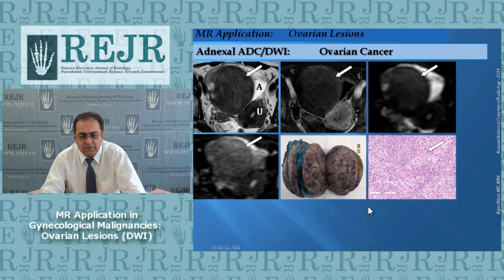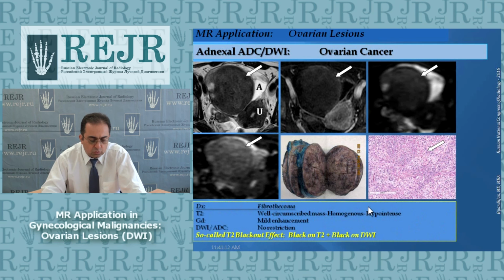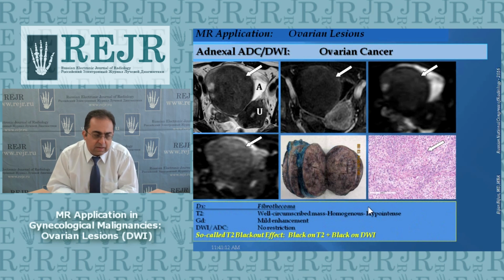These are from our series. By the way, I have to give credit to one of our former residents, Dr. Lisa Chu, for putting together all this material for a publication that we have been working on. Hopefully it comes out soon, and I really need to thank her for all of her hard work on this project. This is another case that we had.